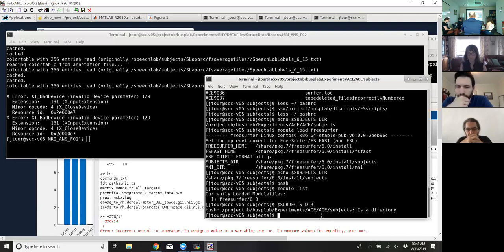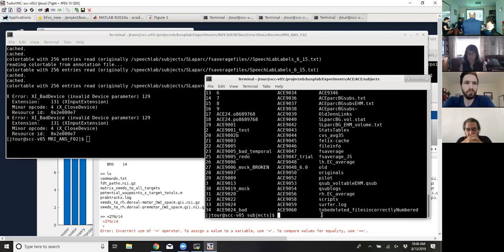Okay, so now you can. So let's see. If I pick this up here. So if I do.